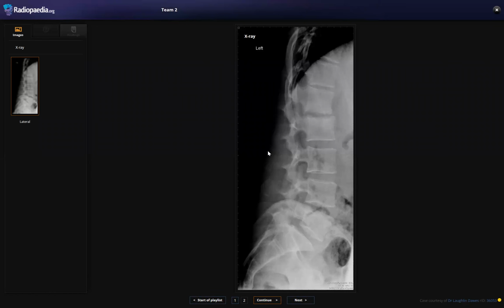If the patient is clinically having fever or high CRP, this will confirm my findings, and I need to correlate with any previous imaging if available. Further, we can suggest MRI. Why MRI? To rule out any spinal cord involvement or phlegmon, which I don't see on this image.